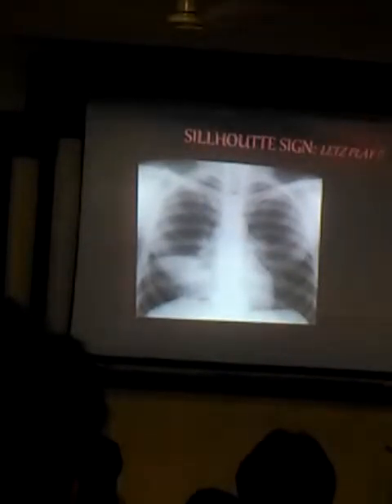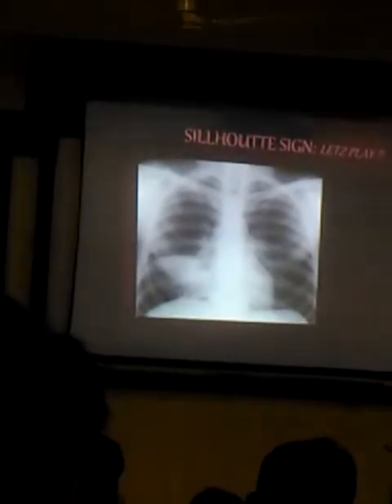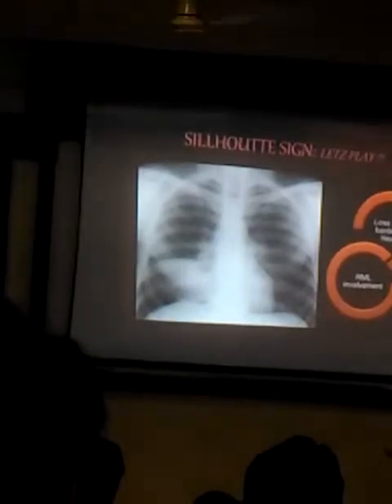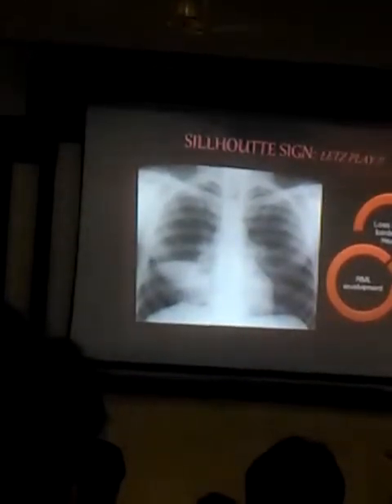The right middle lobe, anatomically, consists of two segments: the medial segment and the lateral segment. Which segment should be involved? Medial. Quite logically, the medial segment. Very good. You are correct. See, this is only the first abnormal radiograph of your career.